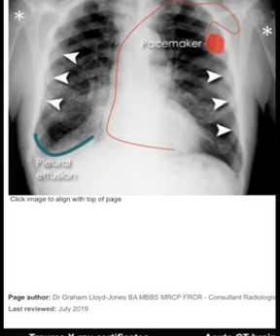Malignant bone disease, pacemaker, dense or sclerotic ribs, arrowheads, patchy dense or sclerotic clavicles and humerus, asterisk, bilateral lower zone consolidation with a pleural effusion on the right, no pathological fracture seen. Clinical information: known prostate cancer, cough and fever. Diagnosis: pneumonia with associated effusion and metastatic bone disease.